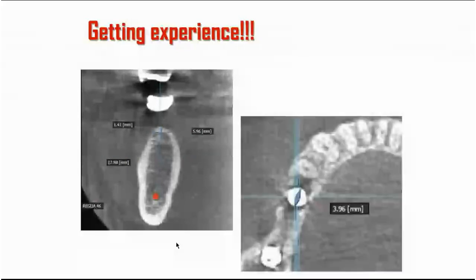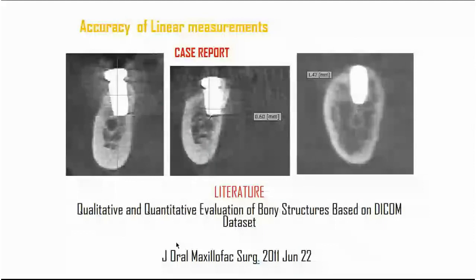Then we put a known size of implant healing abutment on the phantom head, and we did the measurements, and it was obvious that the software is not lying to us. So we need to do some orientations to be able to know whether we are orienting ourselves correctly or not. Although we are not advised in any kind of articles to make control CBCTs in order to see the result of our surgery.